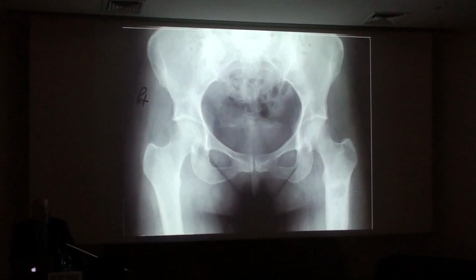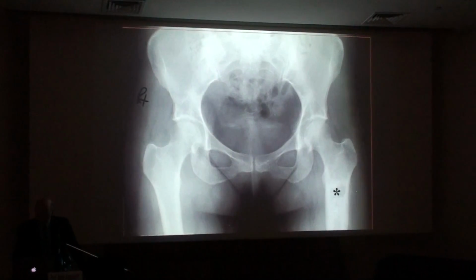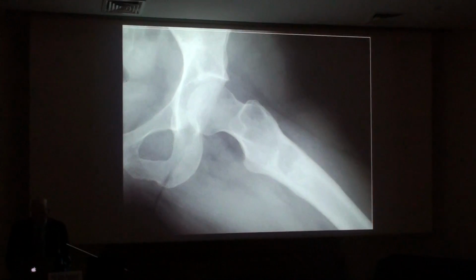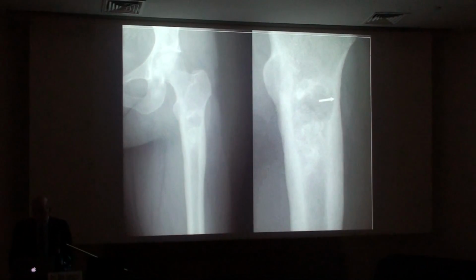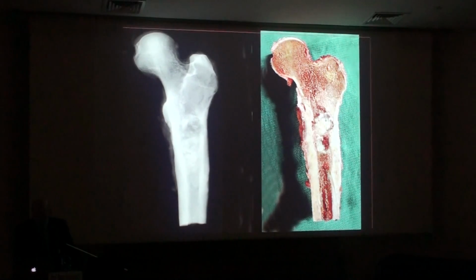Here, a chondrosarcoma picked up on a DEXA study as an area of increased opacity in the proximal femur by a very alert radiologist and referred to us for this lesion. You can see the change in the cortex or in the pattern of mineralization. Unfortunately, there were no old films. This was a new finding. You can see the deep endosteal scalloping, the solid continuous periosteal new bone, all the features of a low-grade malignancy in this low-grade chondrosarcoma cured by en bloc resection.